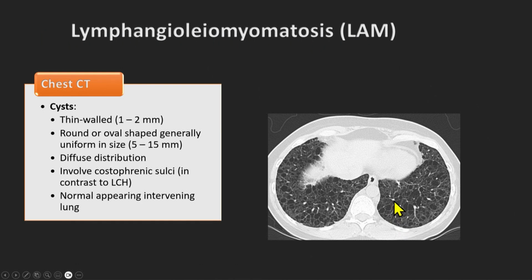Okay, so we got LCH out of the way. So different from the other cystic lung diseases. It's kind of a home run. We used to biopsy those patients. We used to think that we had to biopsy them. But I'd say most chest radiologists now, it's really an imaging diagnosis. We rarely biopsy these patients with pulmonary Langerhans cell histiocytosis because the imaging characteristics are so specific for this diagnosis.